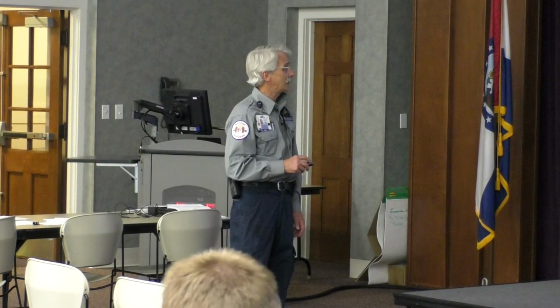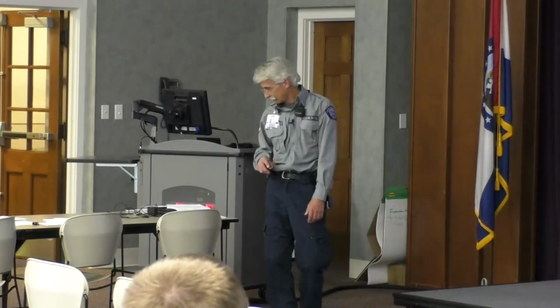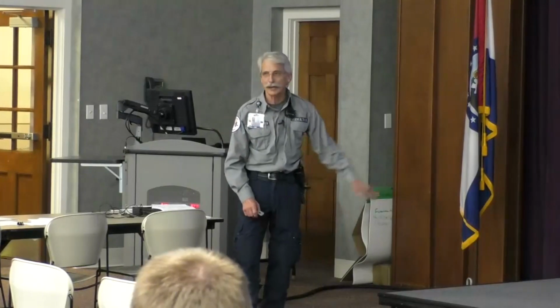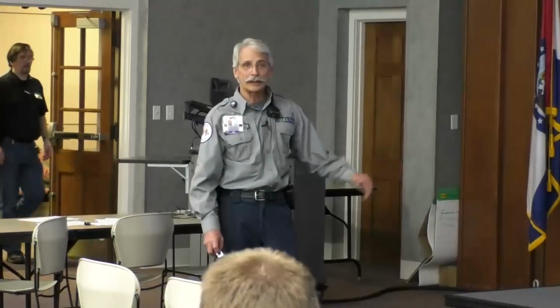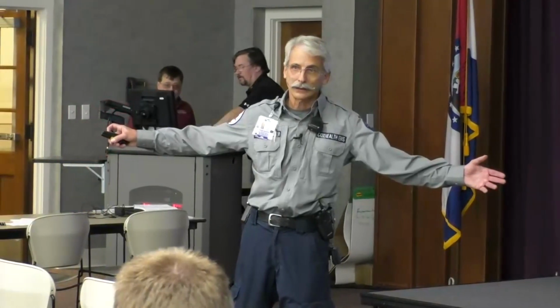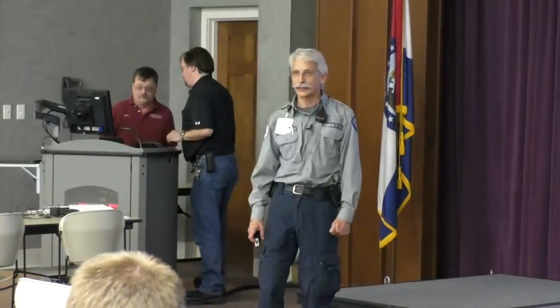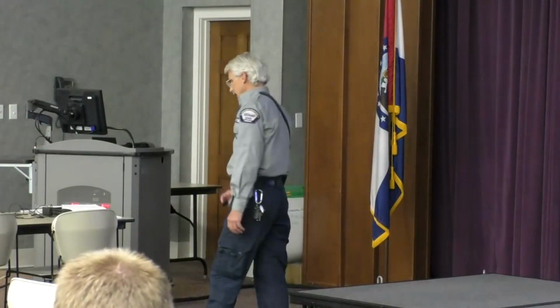Do we see any ST depression? Maybe in V5 and 6. Yeah, I think there's some in V5 and 6, but we're not going to worry about it a whole lot. We've got enough here that it meets the Sgarbossa criteria, so we're going to treat it like an MI. If it didn't meet the Sgarbossa criteria, would I treat it like an MI? What made my decision about that? Look at your patient. What's your patient telling you? If your patient is sick, having chest discomfort, or any of the signs that tell us it's cardiac, then you should treat it like that. All right.